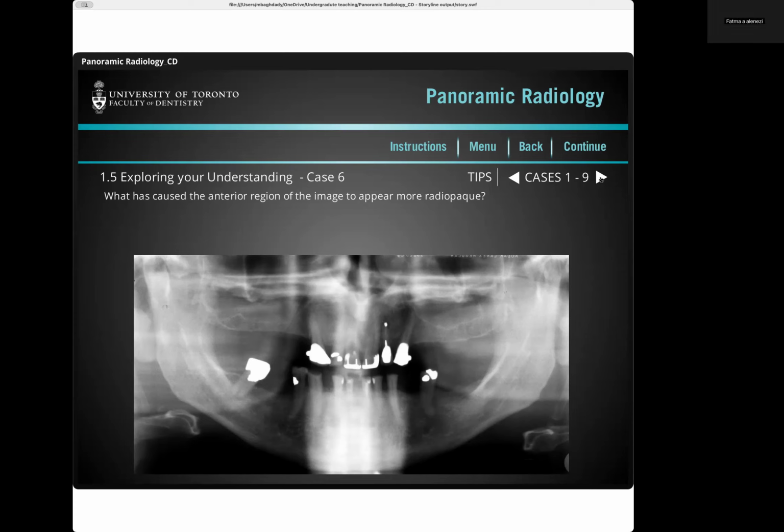Did the patient tilt the chin? Tilting the chin, remember, we have that nice little curve, which is fine, but something specifically is happening in the anterior. What is bothering you about this image? What is bothering you? It's very nice. Somebody just said it. Hunchback.